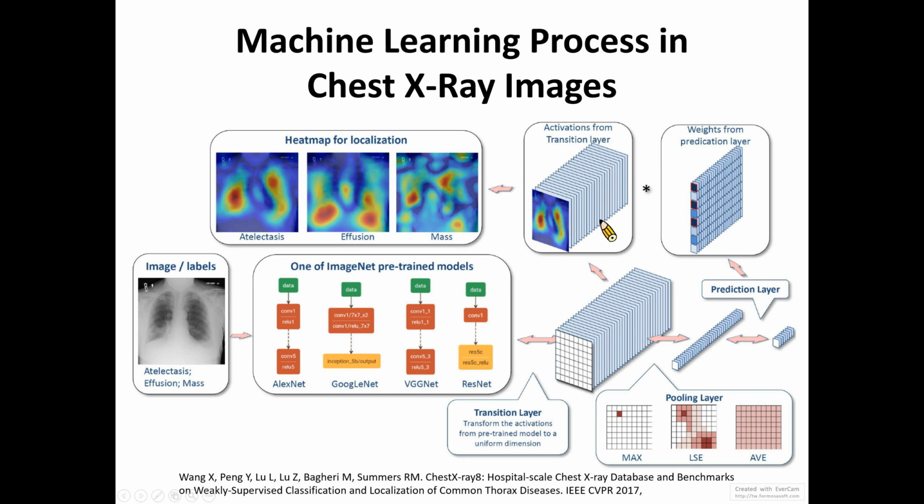So in this case, there is pneumonia, there is a blunting of the costophrenic angle, which means that there is pleural effusion, and maybe there's also lung fibrosis because of very severe lung infection.